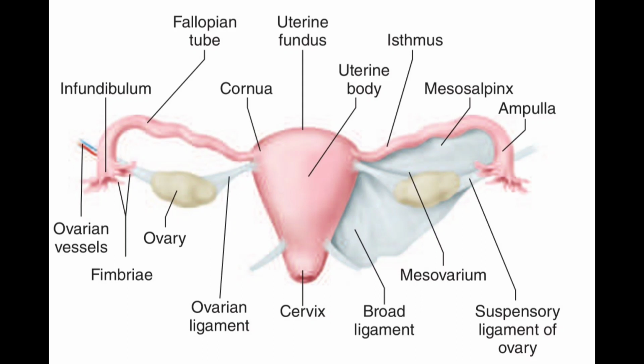So far as the fallopian tubes are concerned, you cannot see them normally if they are normal in size and shape, because it's a tubular structure, unless it is enlarged because of any pathology, could be hydrosalpinx, pyosalpinx, or any other malignant masses, or even sometimes pregnancy. Then you can appreciate the fallopian tube, otherwise you can't. So this is the normal anatomical review, and in this shape you can see all these structures on ultrasound imaging.